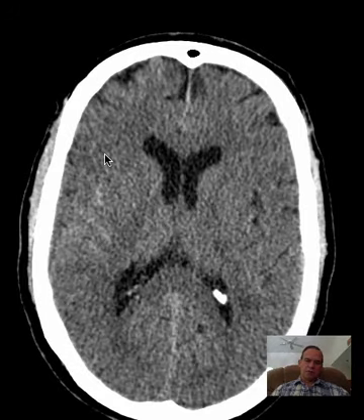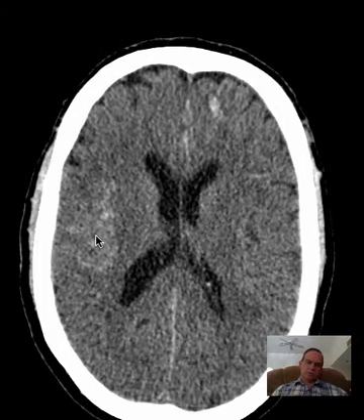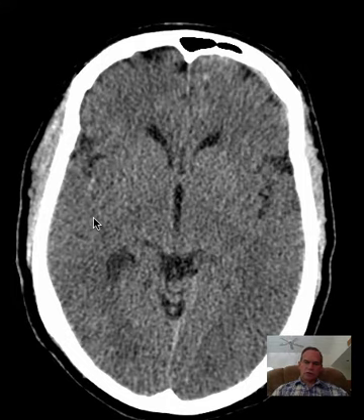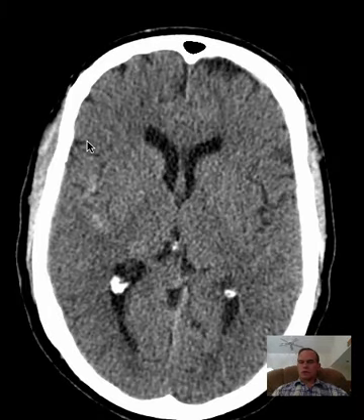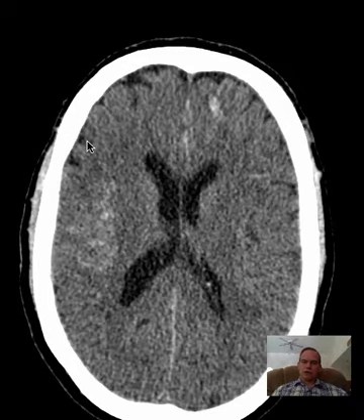But the depth of the Sylvian fissure is opacified with blood, subarachnoid blood, and that's what we're seeing here. And it's in the dependent aspect of the Sylvian fissure, because if we go farther forward we find that it's not filling the very anterior-most aspect of the Sylvian fissure, which is typical for a subarachnoid space. It's going to move about freely within the subarachnoid space.